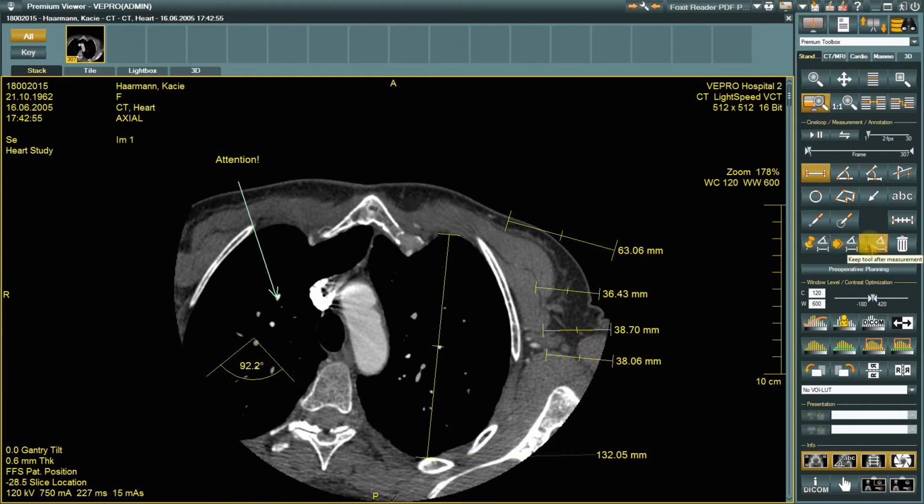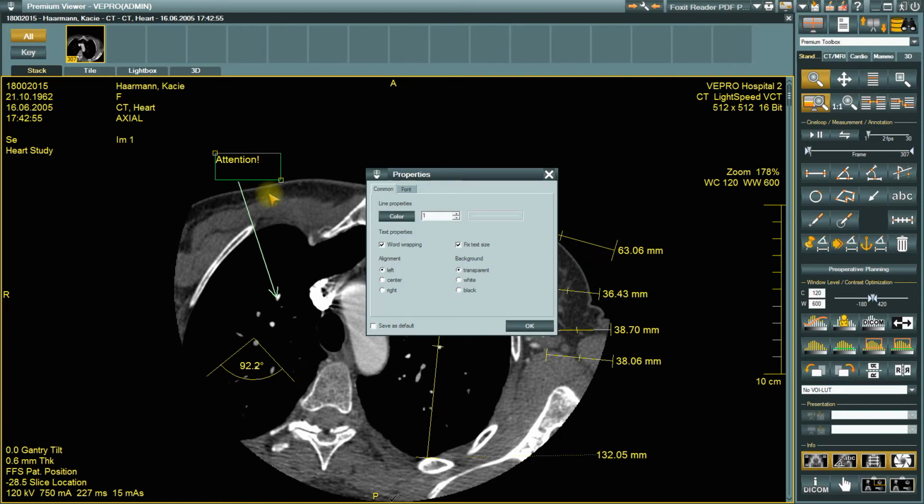By right-clicking on a measurement object, you can call up a context menu. The entries in the context menu will depend on the measurement object. For each measurement, you have the option, via the properties, to, for example, change the font color or display or hide additional information. All settings for a function can also be saved as the default for the Windows user who is logged in. Since the properties for each measurement object are different, the properties are explained only on the basis of examples and not for each measurement object.